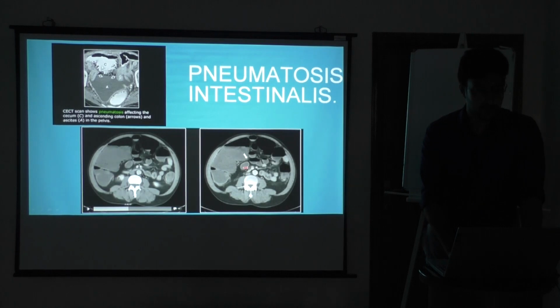They have given the contrast, so you can see the enhancement. So it's obeying the laws of gravity. Gas is above because it's lightweight. It is staying up, but you can see small spicules of gas in here. So this is not following the laws of gravity, so it's abnormal. So the condition is pneumatosis intestinalis.